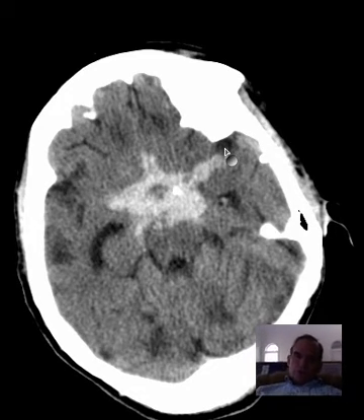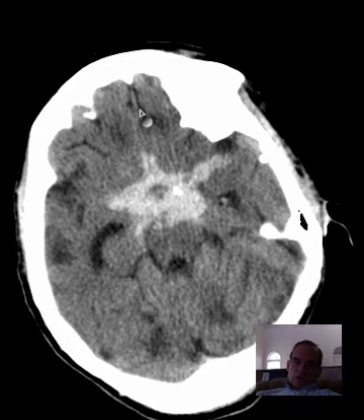and those are these cisterns that go in the anterior interhemispheric fissure here as they follow the anterior cerebral arteries, and toward the sylvian fissure laterally here, and the middle cerebral artery cistern, which is where the middle cerebral artery itself courses as it approaches the convexity of the brain, at which point it starts branching over the convexity of the brain.